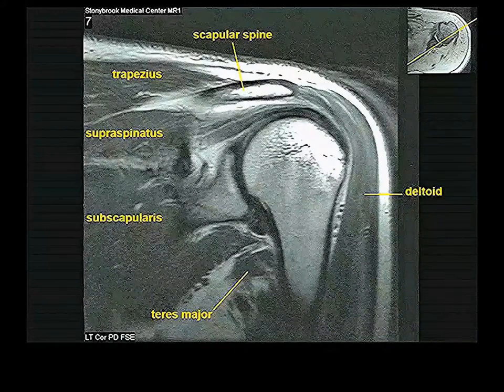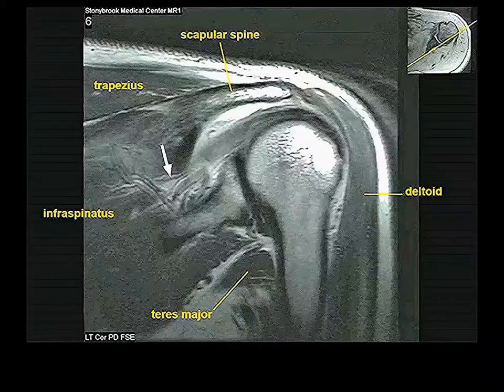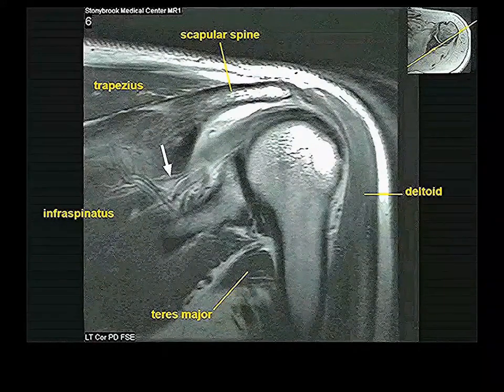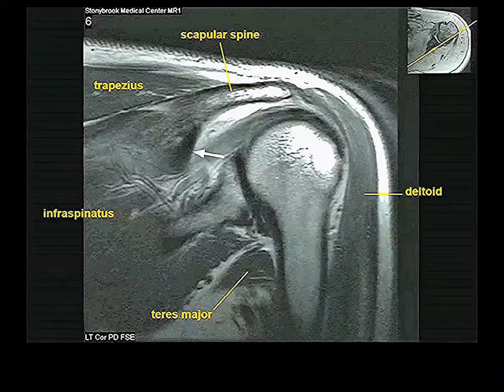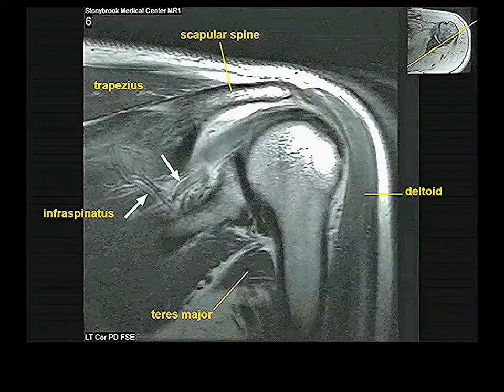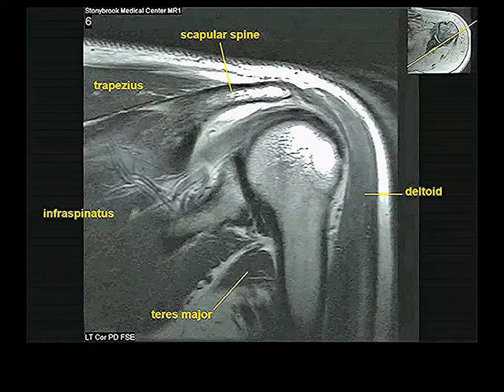Still nothing so exciting. Here's some exciting things. Here's the actual base of the scapular spine, and here's the projecting part of the scapular spine, this part that projects laterally. That means this is the scapular notch, what's called the great scapular notch. These vessels, they're vessels of the infraspinous fossa. They're either directly derived from the suprascapular artery, or they could be derived from the circumflex scapular artery, because that also supplies the infraspinous fossa.